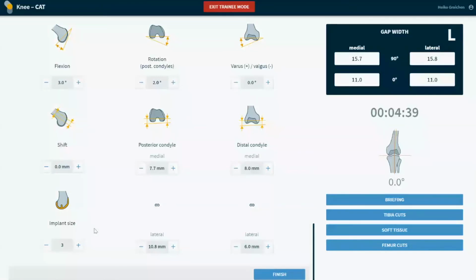So if you just increase the size by 1, then you see that you add 4 millimeters on the posterior side. So it's almost done. The rest of that size difference you can adapt by increasing the flexion to around 4 degrees. Another option would have been we stay constant with the size, so we go back to 3, flex the femur more, and you flex over that anterior reference point. So you can flex it to 6.